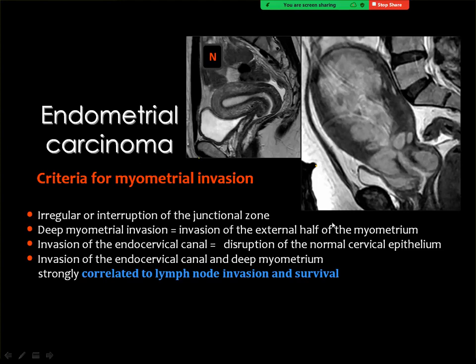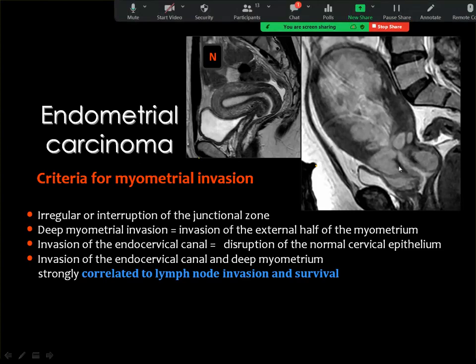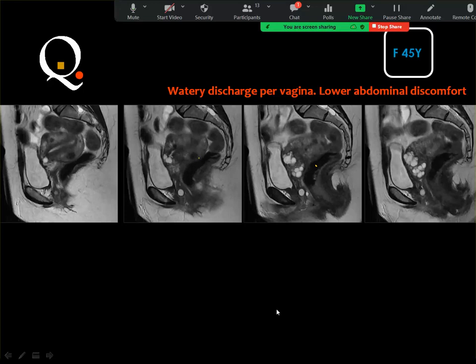And sometimes you got an endometrial mass which is invading the myometrium, and this is endometrial carcinoma. If the carcinoma has extended to the cervix, this is a stage 2 endometrial cancer, but the cervical cancer is totally confined to the cervix, it may extend into the uterine body, and at that time you will see that the main bulk of the tumor is localized to the cervix.